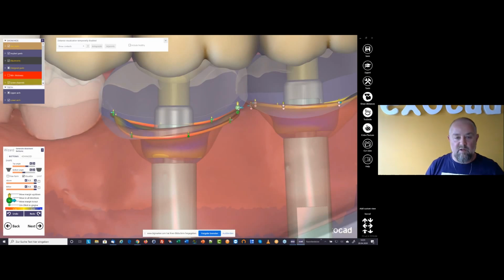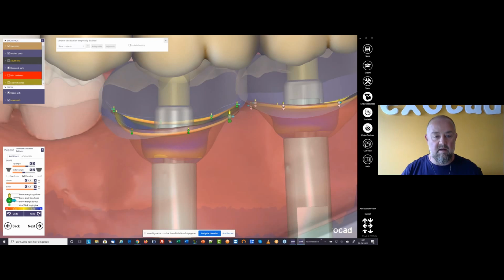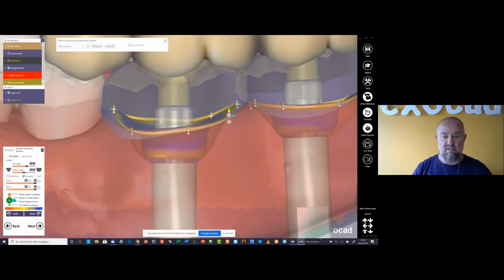This is very important if you do a custom abutment, because you don't want to see the cervical border of your crown later, which can then be above the gingiva. You want to have it below the gingiva. But in this case here, where we are doing a screw-retained crown, which is a monolithic crown, I can stay here, and I could even stick them back to the gingiva. It was just to explain how I would do it when I'm doing a custom abutment.